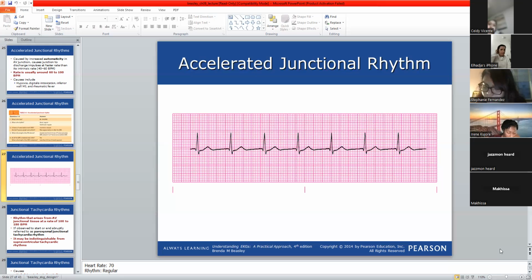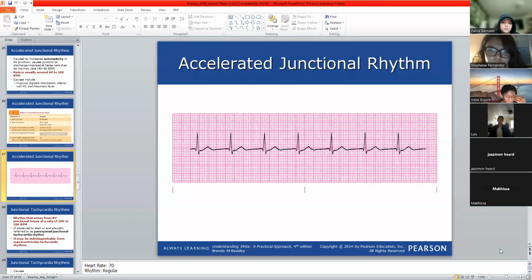Okay, stop. Okay, CD. Yeah, so it's 70 beats per minute. It's narrow, and the P wave narrow. What is narrow? No, we don't go in this order. The order is 5 steps. Go in order, please. Okay. So the rhythm is narrow, and the P wave. No, this is not the word to describe the rhythm.